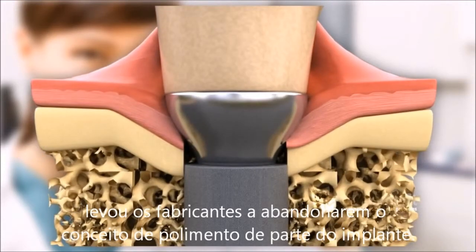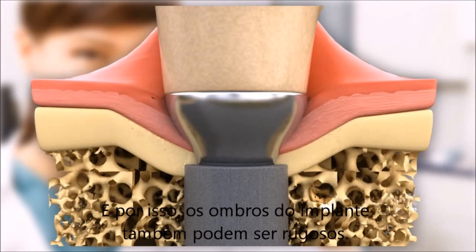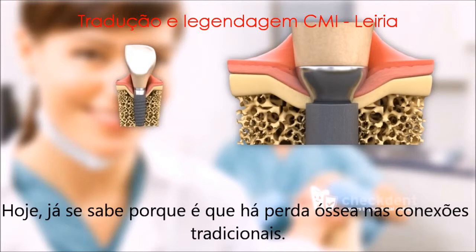As a result, manufacturers renounced polished surfaces as well. Implants with conical connections showed bone development all the way to the abutment. Therefore, the implant shoulders could also be roughened. Today, we know why there is bone loss with plug-in connections.